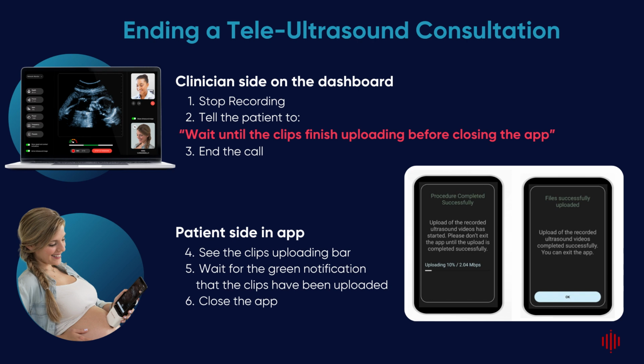It is important to emphasize that the app must remain open until the upload is complete. If the app is closed before the upload finishes, the patient will need to reopen the app. The upload will automatically resume once the app is reopened.